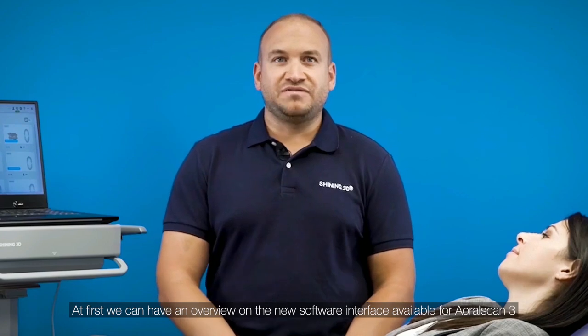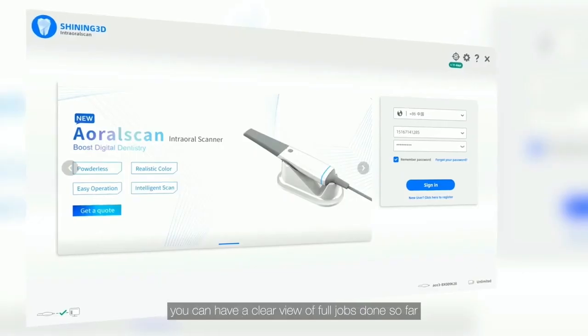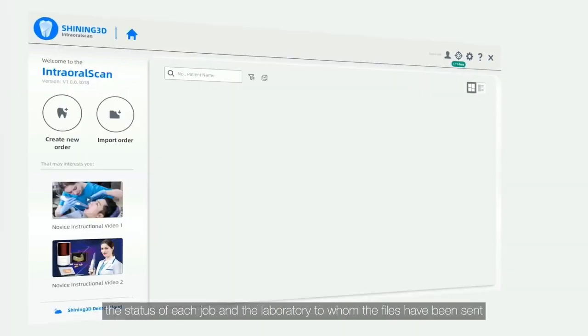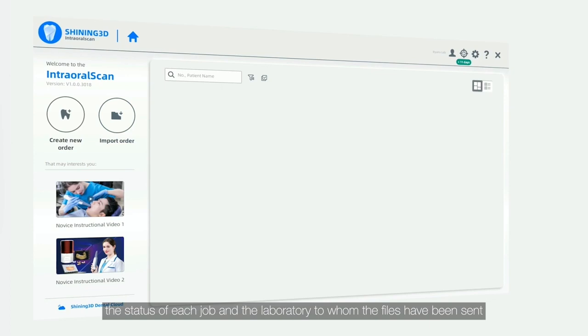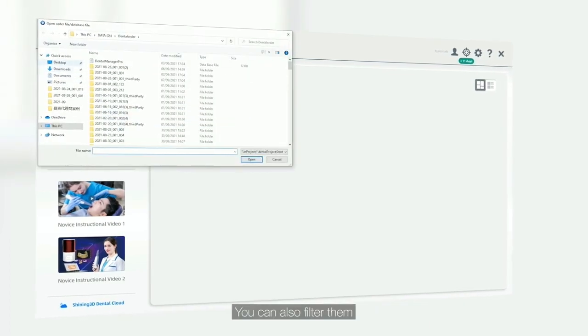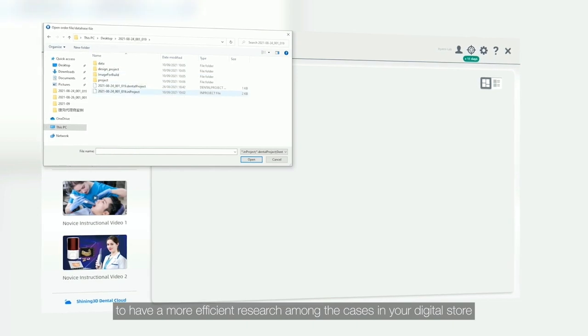At first, we can have an overview on the new software interface available for Aoralscan 3. This new interface has been developed to be more intuitive and user-friendly for both expert and non-expert users. As soon as you open the software, you can have a clear view of all the jobs done so far, the status of each job, and the laboratory to whom the files have been sent. You can also filter them to have a more efficient research among the cases in your digital store.